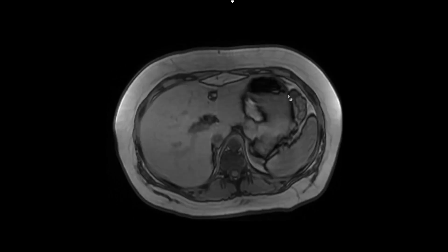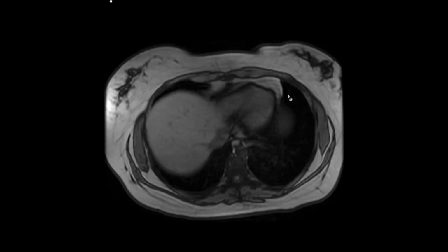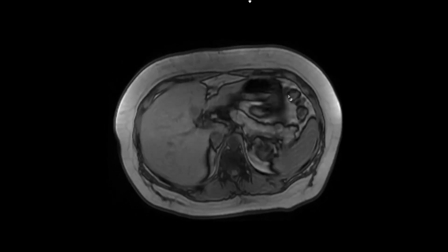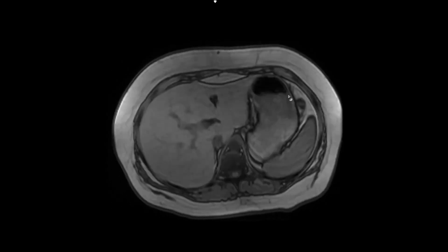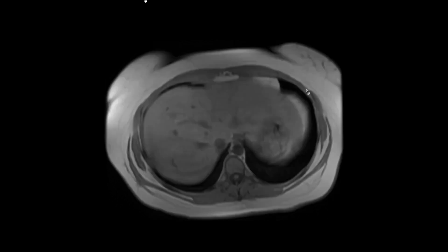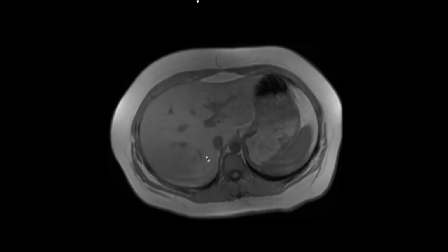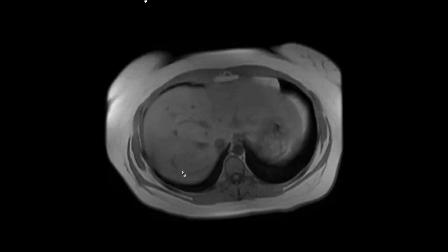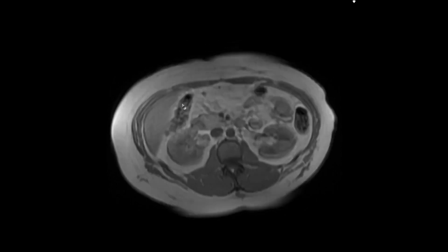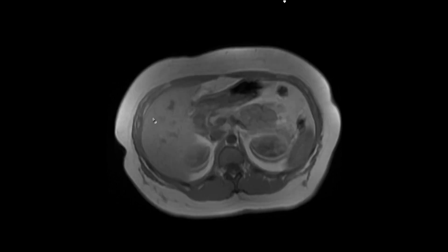Whenever we're characterizing liver lesions especially, we want to look for intravoxel fat because that'll change our differential diagnosis. Here on the out-of-phase images, there's no background fatty liver. Of course, we compare to the in-phase and usually look at them side by side. So here on the in-phase images, we can see that this is slightly T1 hypointense posteriorly here, and these ones are slightly T1 hyperintense.